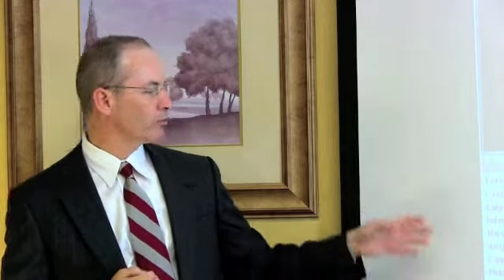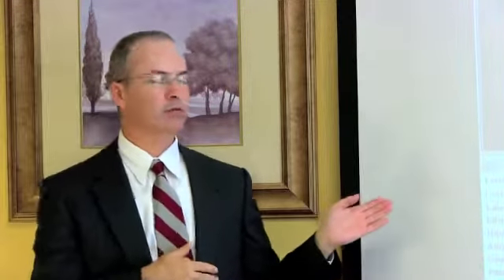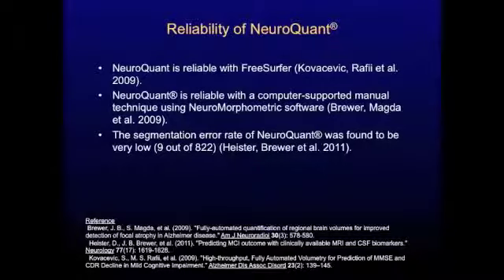Now, 3 of these brain regions were also shown on page 1 of the NeuroQuant Standard Report and compared to normal controls. These additional 8 brain regions, although the volume is measured, the volume's not compared to normal controls. And that's a limitation of NeuroQuant currently, and one that we wanted to improve upon.